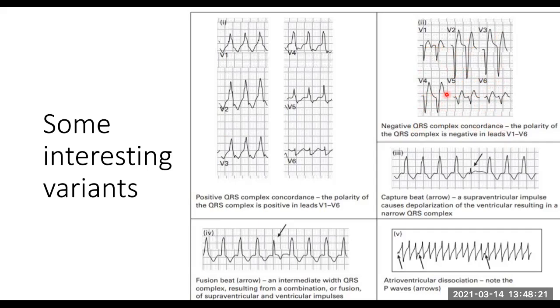Now, this one is just something that you can see. And these are just for interest's sake. This is nice to know, but if you don't remember them, don't worry. All right. So a capture beat.